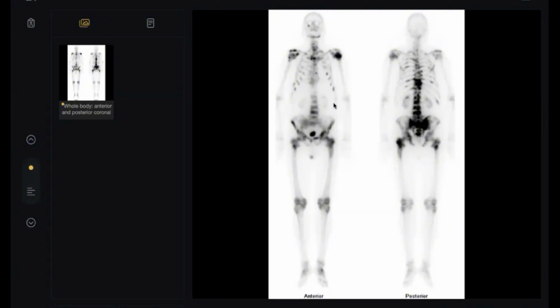Okay, doctor, you must speak about the kidney. Is this a super scan or not? There is mild increased uptake in the kidneys. It looks like usual. Is this a super scan or not? Sir, as I can see uptake in the kidneys, this is not a super scan. So we must also tell the examiner this note. Thank you so much, doctor. This is prostatic mets.